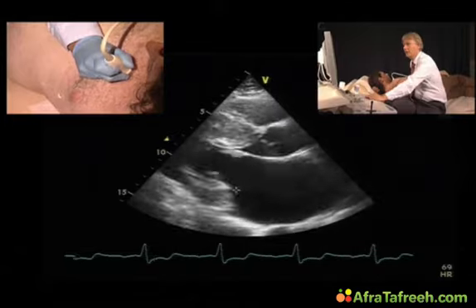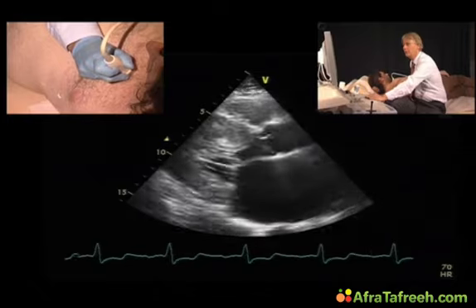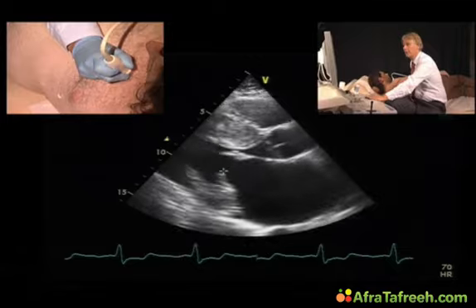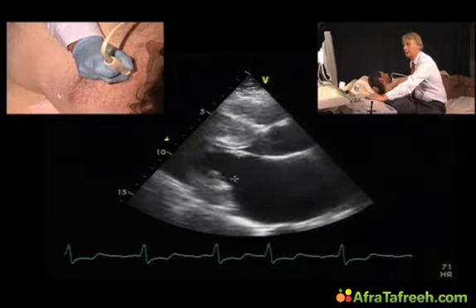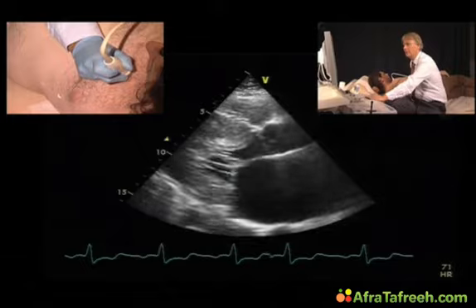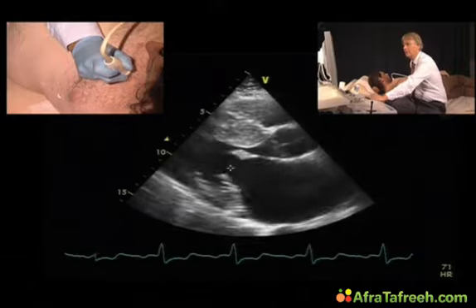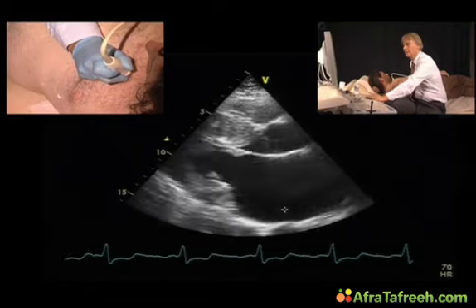And what we also see is that it is not only the anterior leaflet which moves towards the septum, but also the posterior leaflet. You can also see that there is a regurgitant orifice almost visible in 2D here at the mitral valve, and that this orifice probably directs the jet posteriorly.